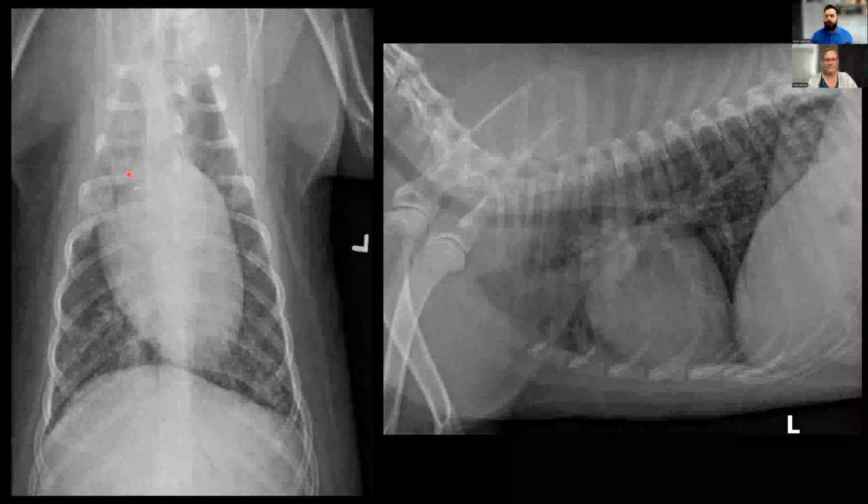We also have throughout the thorax, and it's really nicely visible, especially in the caudodorsal thorax here, these numerous small, almost punctate-like nodules, which we could sometimes call a miliary pattern. This is where the pattern of the lungs looks like millet seeds, and this fine nodular pattern is often implicated in a couple specific diseases that we'll get to soon. So we've got this miliary pattern as well, and then we have portions of the lung which just have this hazy increase in opacity, especially here in the left caudal thorax, which obscures vessel margins, as well as has increases in opacity along the airways themselves.